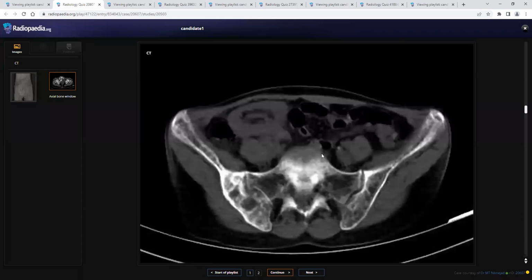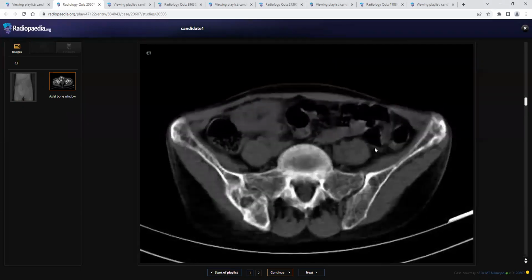As you told, we have proceeded with the CT. This is your CT. You can have the mouse control, otherwise you can request it. Yes, I can request it. Okay, I request it now. You just click on the first image and start scrolling through with the mouse button.